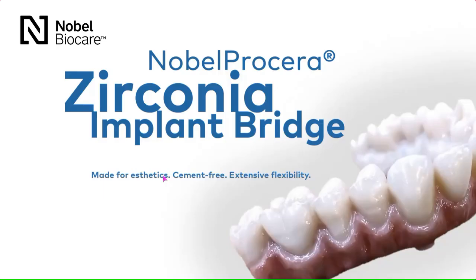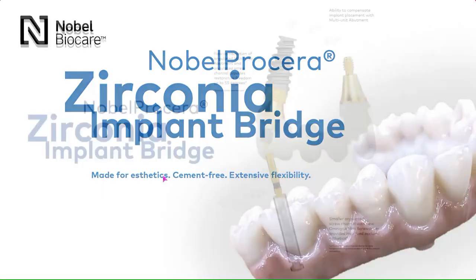And Chuck's going to go through that exocad software with you shortly to show you how we can now easily design these bridges.